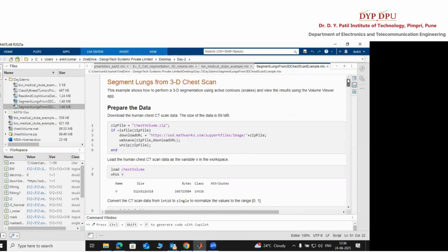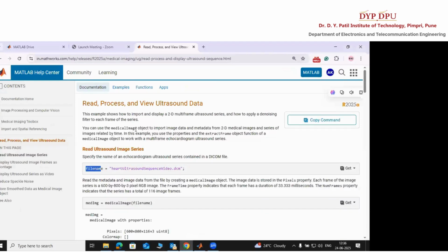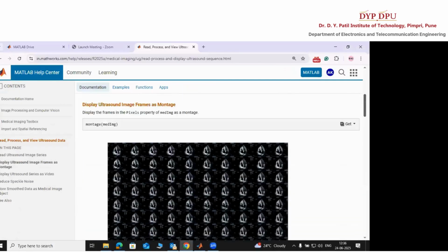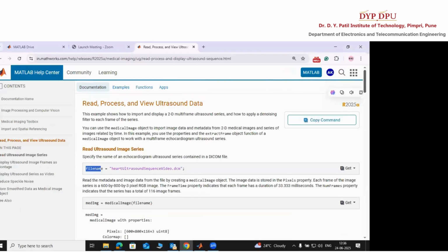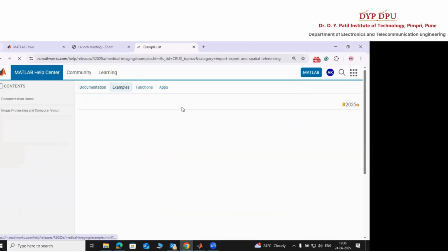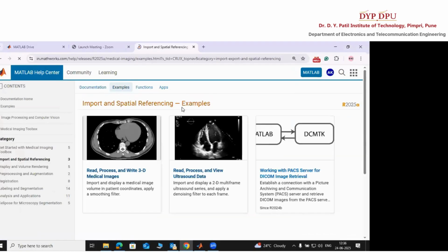Yes. Good. Now come to the documentation page, as I already talked about. Okay, so here we can do further things for the analysis. So now it is time to switch to the AI. Okay, so there are so many examples. Due to the time limitations, I'm just sharing.